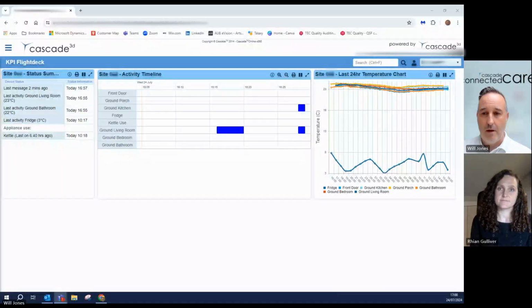Excellent. So I understand your mother's had one of our Cascade 3D connected care kits installed in her house. Yeah. And you should have also had some information from the installation team on a username and password you can use to access our dashboard. Yes. Excellent. So I'm just going to give you a very quick 2-minute overview of our dashboard. I'll just share my screen. Okay, has that come through?